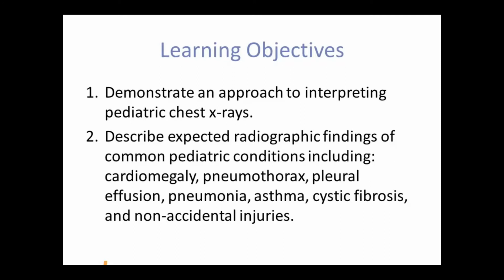The learning objectives for this video are to: 1. Demonstrate an approach to interpreting pediatric chest X-rays, and 2. Describe expected radiographic findings of common pediatric conditions including cardiomegaly, pneumothorax, pleural effusion, pneumonia, asthma, cystic fibrosis, and non-accidental injuries.